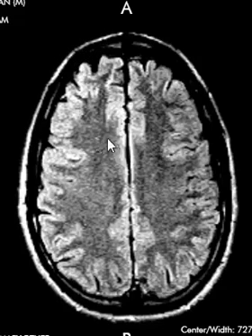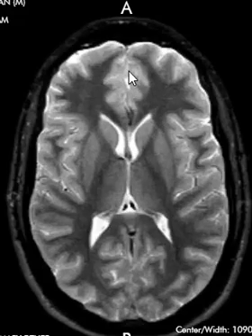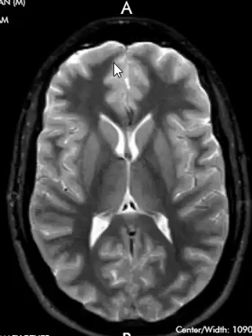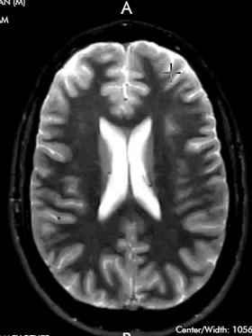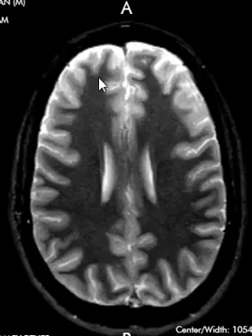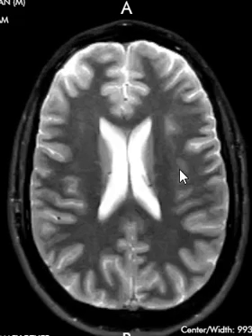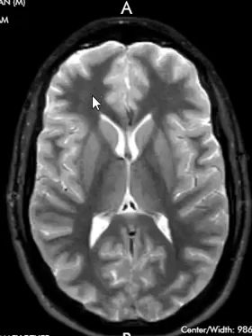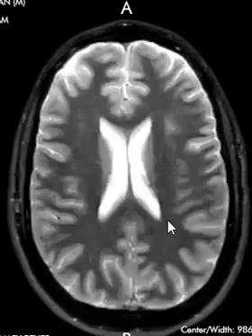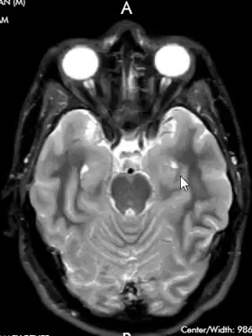Patients with multiple sclerosis will have little white matter lesions. This is just another view that really shows the difference between the gray matter, again, the gray matter on the outside, and then that white matter, which is the dark uniform stuff centrally. And again, we look really, really carefully at all the white matter, make sure there's no evidence of multiple sclerosis. There's no evidence of chronic small vessel ischemia. There's no small tumor within the white matter or within the gray matter. And go up and down, and we also look at the ventricles again. So in the end, this is a nice normal patient.